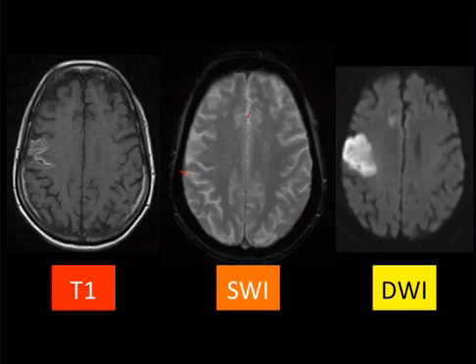2 was a cavernoma. And 3 was to either prove or disprove the presence of blood products. So that's the scenario we're looking at here, where we've got something here that we think is blood, but then we were provided with a hemosiderin sequence and we see that it's clearly not blood because there's no blood products. So if it's not blood, then what is it? So remember, there's a list of stuff that's also T1 bright, and you should have that sort of on the tip of your tongue or on the tip of your finger.